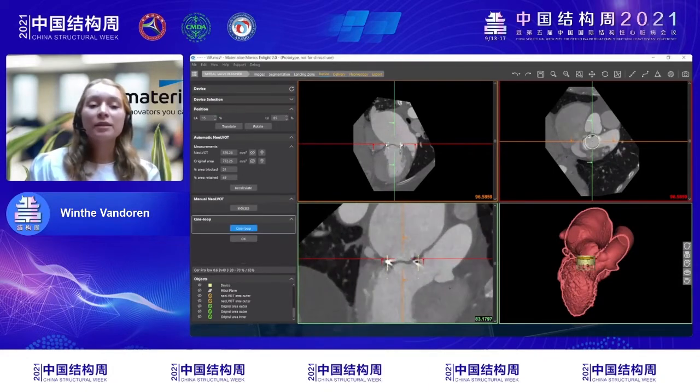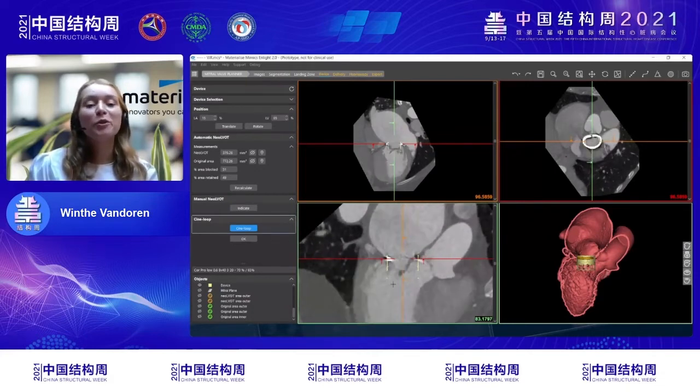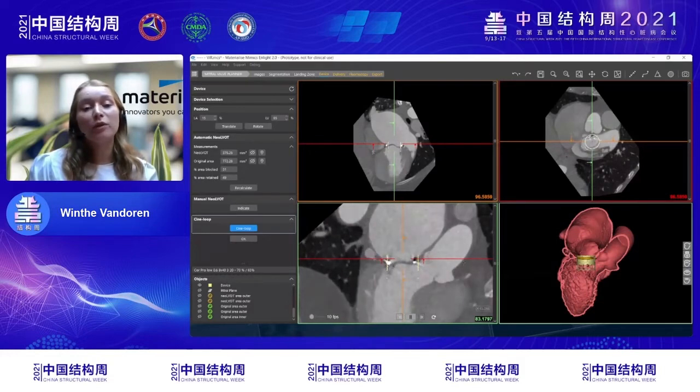And I think this can also be useful already because it does give you some insight into the changes of anatomy throughout the cycle. However, it's still in the CT scan. It's not yet in the 3D model. It will be in the future, hopefully. But right now you do have this function, and you can also see clearly the leaflet motion on here. So I think that this is also very valuable. What are your opinions on this?